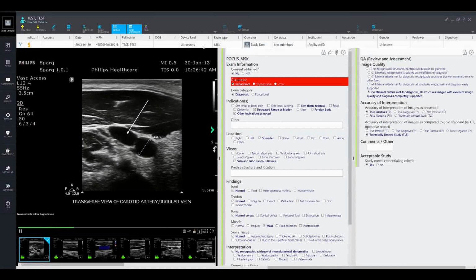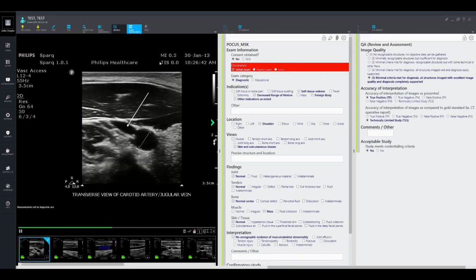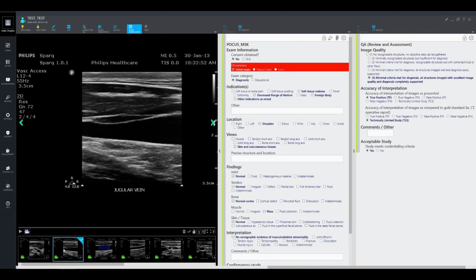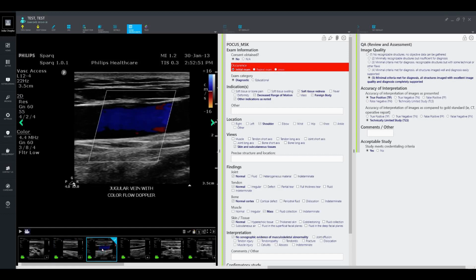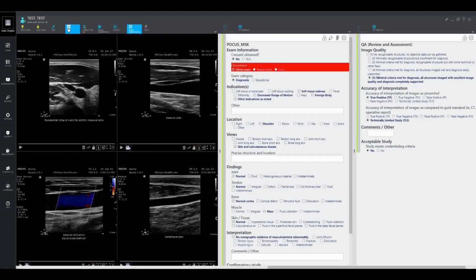Details button will display the exam details as it is shown on the exam list. Enabled or disabled functional commands define the default viewing mode which applies to all exams. Selected image thumbs below the image viewer will open up the related image or clip. Alternatively, user may click on 2x2 button to display the first 4 images in the viewer.